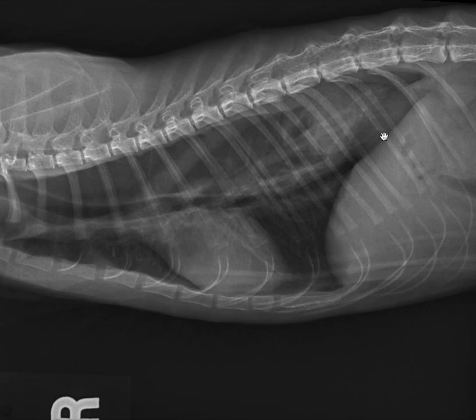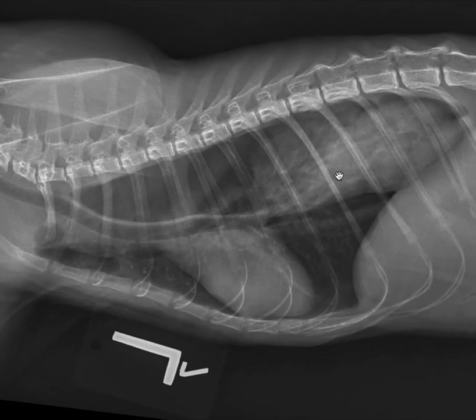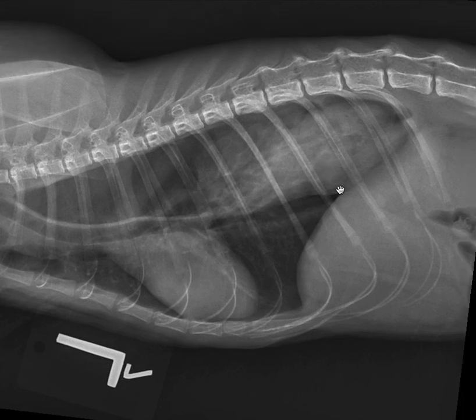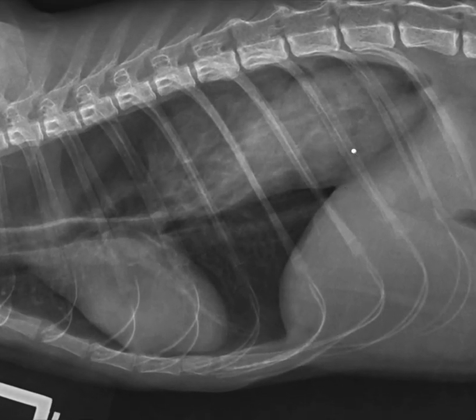The next radiographic finding that we could talk about is opacity. When I look at this structure, I'm able to see more than one opacity represented. Of course, a lot of it is soft tissue opacity, but can you see how superimposed on that, in some areas, there are foci of decreased opacity, which are potentially due to gas?